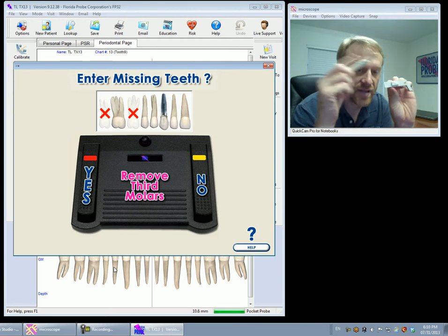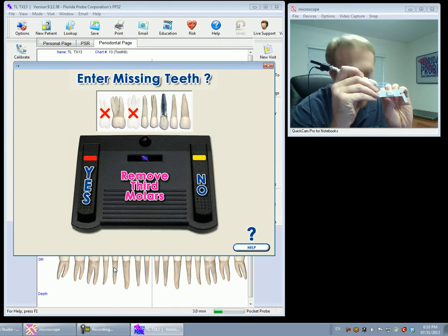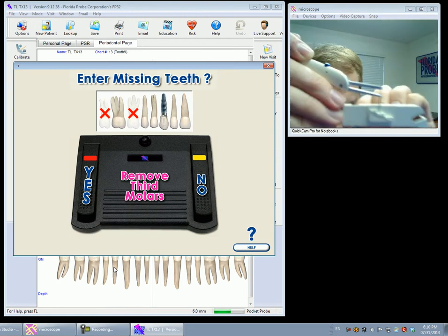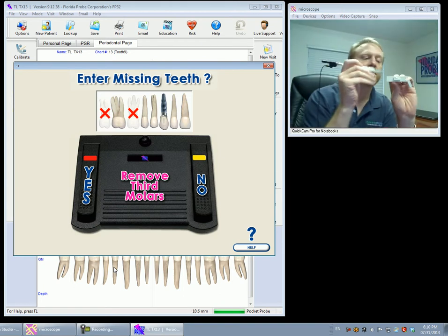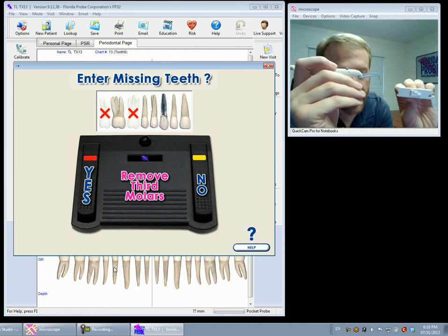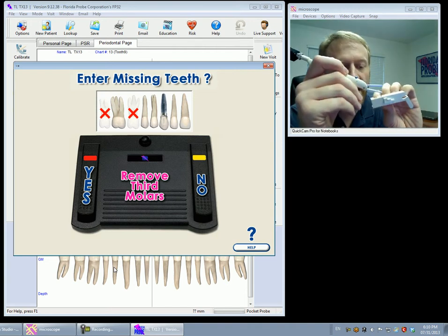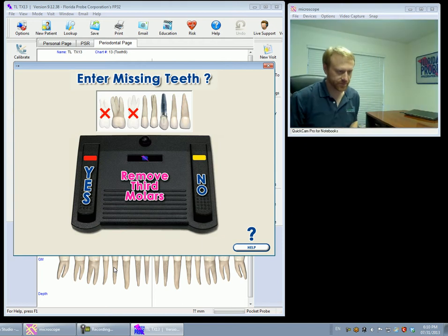There is a tip protector with a set of stair-step measurements that can be made. So if you notice here, that's a 3.0. If I go down to the next step, that's 6.0, and you can go down one more to 9.0 if you choose. So if you notice, my handpiece now is on a flat surface, or if it's too cattywampus, it can pick up 0.2 of a millimeter difference.